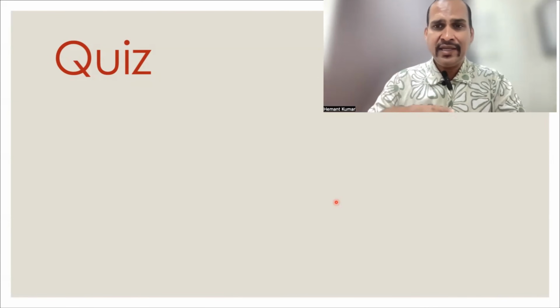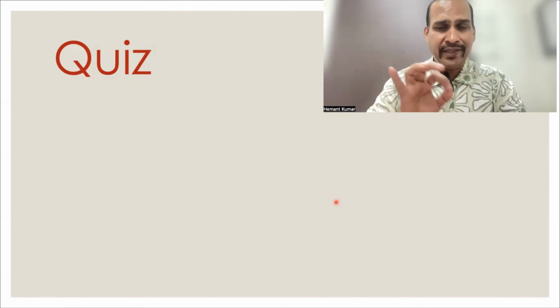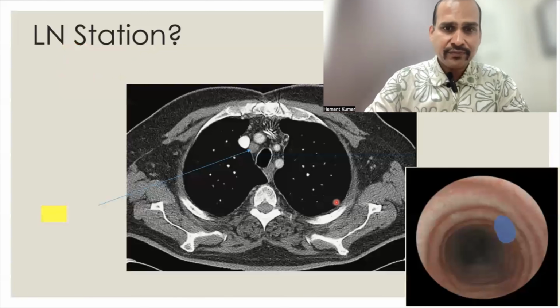How to identify in CT scan? This is quite complicated. So you have to practice, then you will find it easily. So now let's see a quiz.